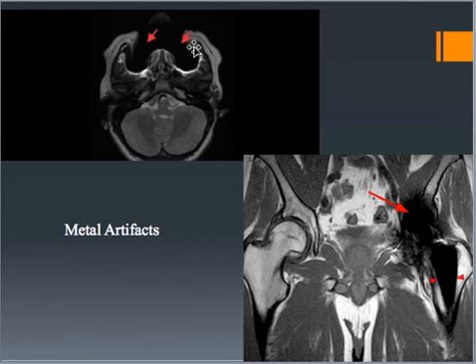Same thing here. This patient, actually, this is a head, brain back here, front of the face. This patient has braces. So you can see kind of the outline of the teeth. This is where their braces would be. So it's just kind of the black hole.